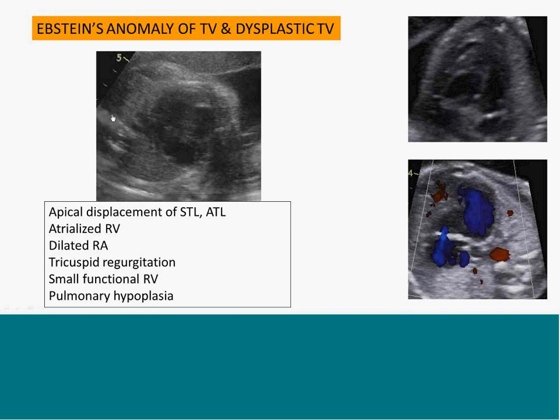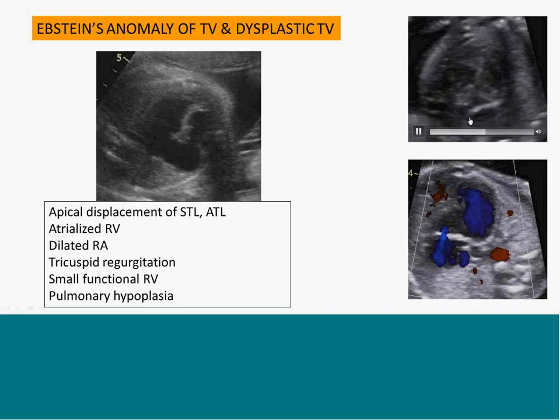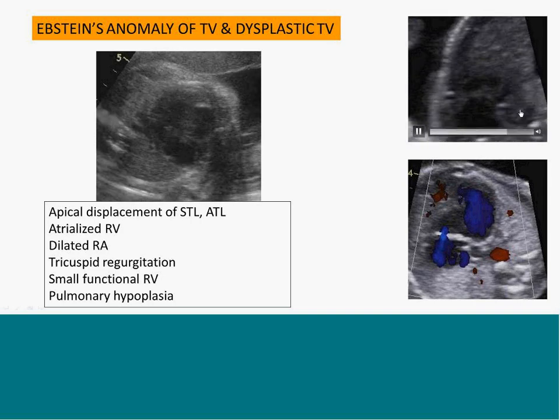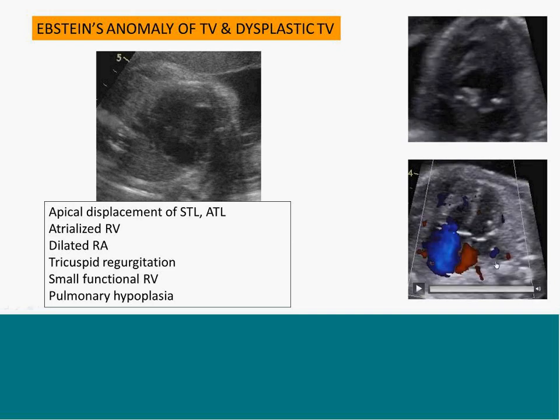When you diagnose Ebstein's anomaly, you can see here in this figure, this is not an Ebstein's, but both the AV valves are prolapsing and dysplastic. So this is the situation where you have a dysplastic tricuspid valve with normal attachments and significant AV valve regurgitation. Wherever you have AV valve regurgitation, it's important to follow during pregnancy and make sure that the child does not go into hydrops.